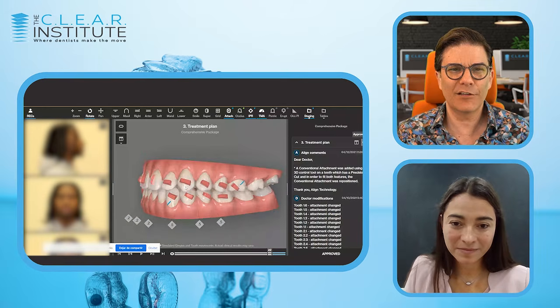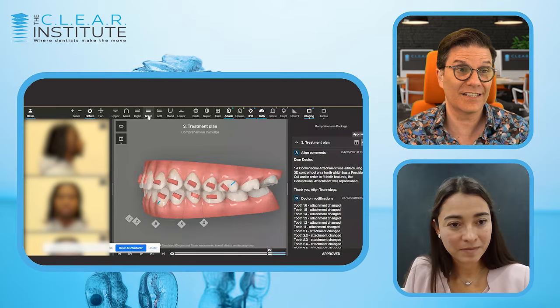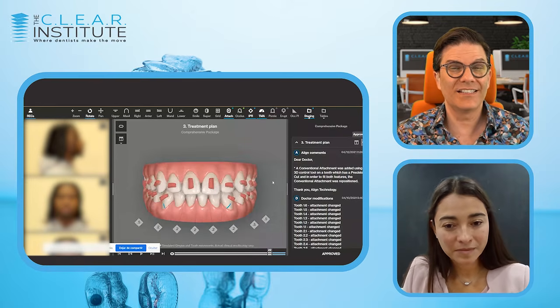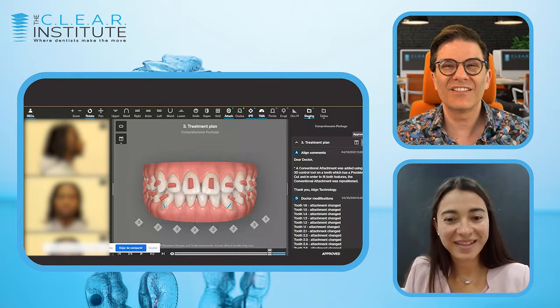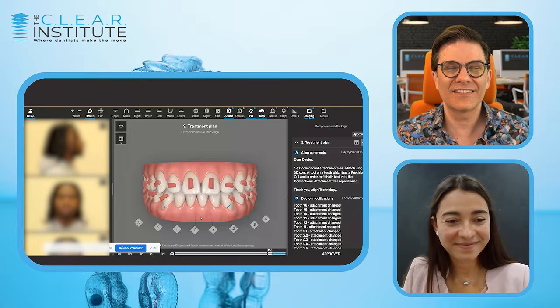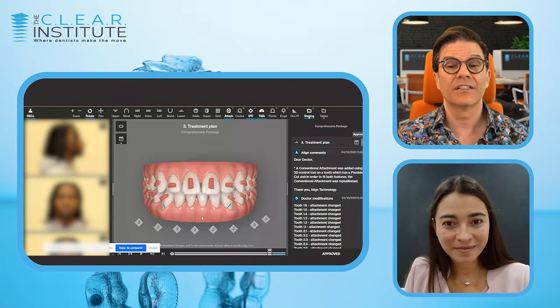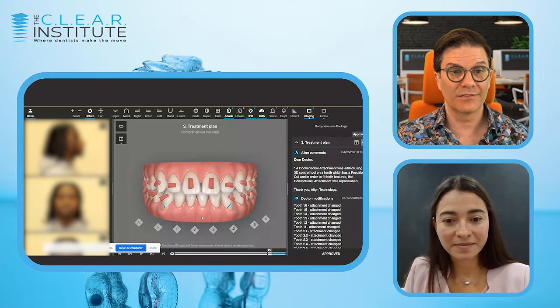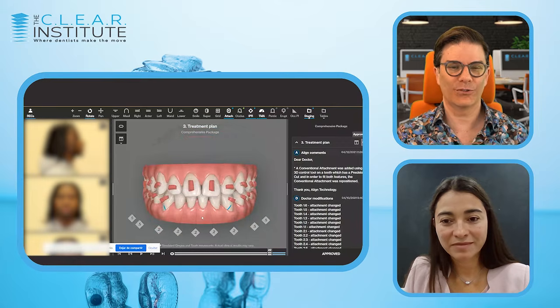As soon as they feel a little bit that the space is coming back, and sometimes it can be even inside one day, they don't necessarily see it, but you can feel that. They will not like that, you will not like that, so better prevent these collateral damages that we don't want to see.